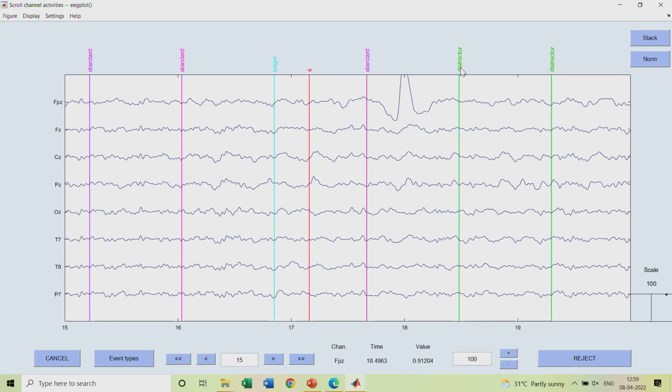So what I will do is take some amount of data exactly before this and then after, so that will give me an idea of how much change this particular event has posed when it happened. So we need to consider some pre stimulus time and post stimulus time of interest. Now this ITI is 800 milliseconds, so post stimulus we should take anything less than 800 milliseconds, it is common sense, and pre stimulus we need to take some data.